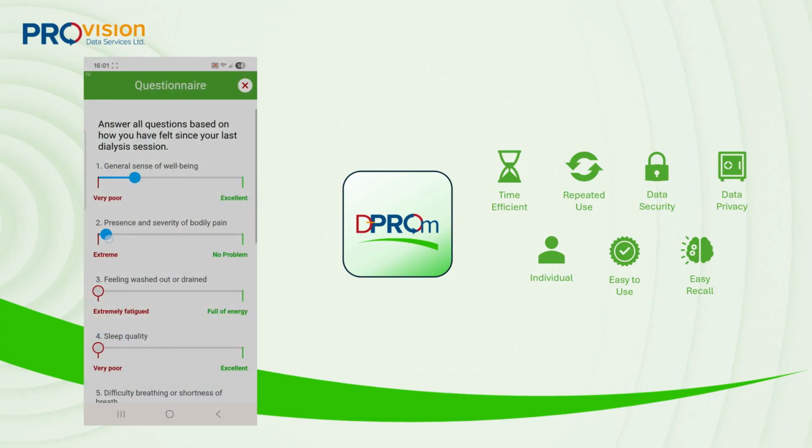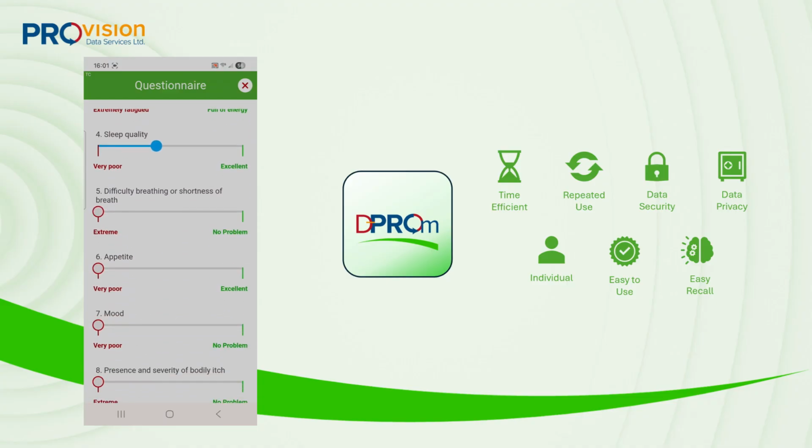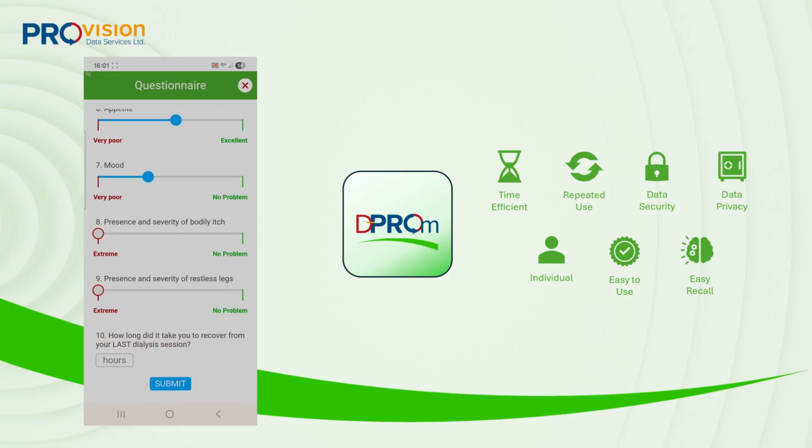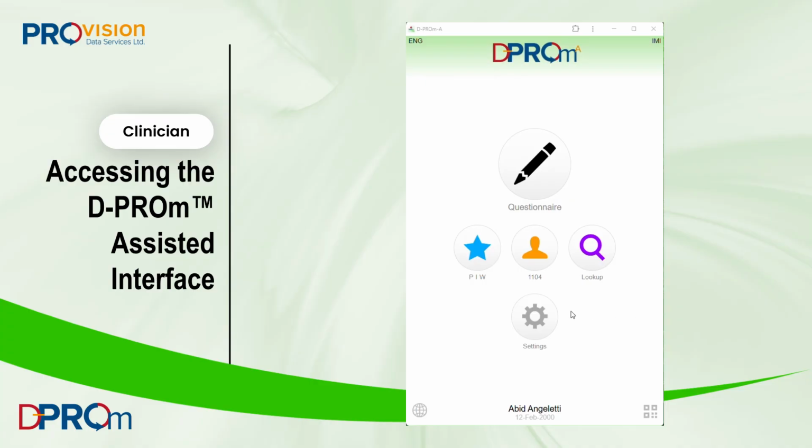This short guide walks you and your clinician through installing and configuring the D-PROm app on an iOS-based smart device. Before we begin, confirm two things. The clinician is signed into the D-PROm Assisted app with the patient information worksheet loaded, and you have an iOS-based smart device with a working camera ready. At the conclusion of this guidance, the D-PROm app will be available on your smart device's home screen and ready to capture your insights. Let's get started by sharing the first steps that must be completed by the clinician.